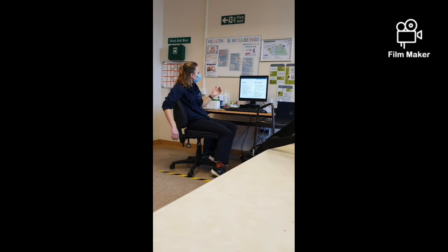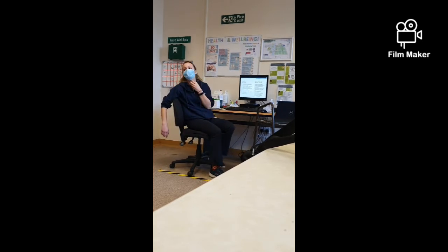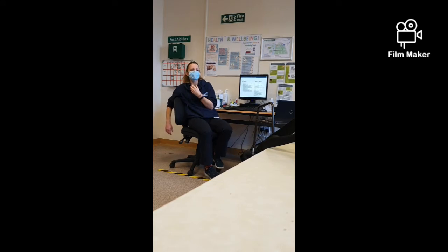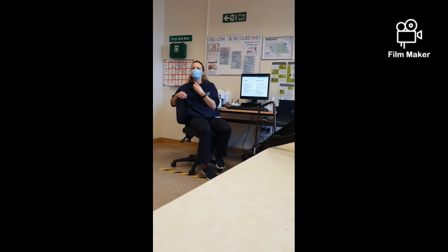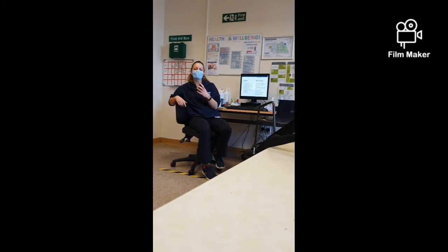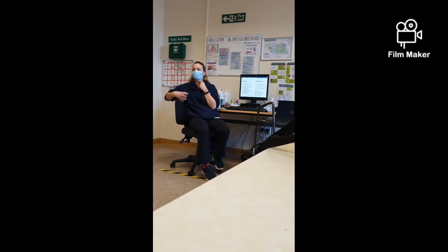Okay. So if you've got a trachea that's slightly deviated, do you know how you can tell what that deviation is? Anyone got any idea? No? Okay. If your trachea is slightly deviated, there's usually two reasons for that. They've either got a pneumothorax or they've got a lung collapse. So if your trachea is deviated to one side, is that because there is a pneumothorax on one side, and we all know what a pneumothorax is?